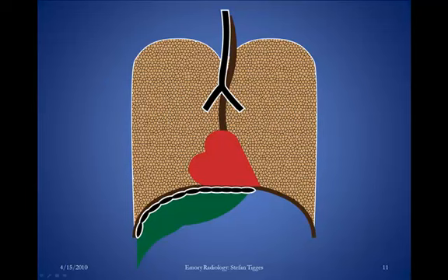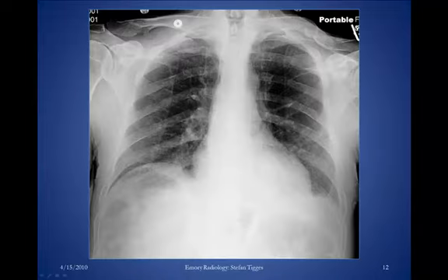One of the ways that you can distinguish that from free intra-abdominal air is that colon, of course, has an anatomy, and I've drawn it very crudely here to look like a string of sausages, but basically you can see the normal bowel markings in an individual who has colonic interposition. So here we have an example.